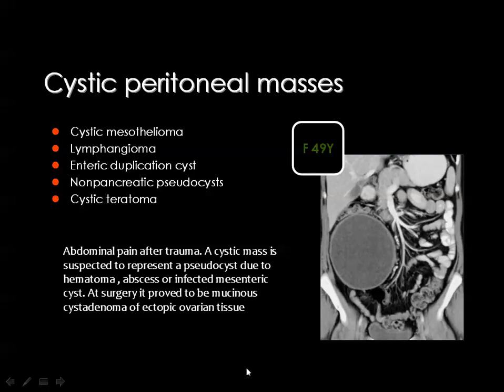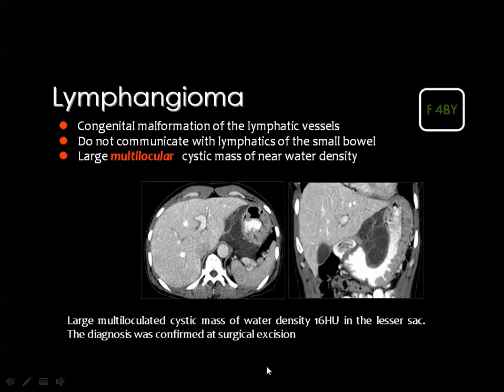Then what I want to say is that whenever you see a cystic lesion in the abdomen, there are some criteria to predict one of the lesions, but many times you cannot predict, and you say only this is a mesenteric cyst for further evaluation.